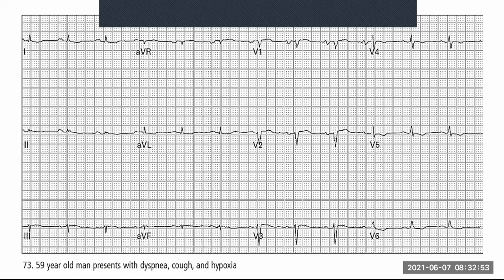But if we were to look at lead 2, where we would normally get a rhythm strip, does that look like a normal P wave? Not at all, is it? In fact, the P waves look a bit weird over there. Agreed. They look almost biphasic. So we know P waves are not normal in morphology. Does anybody know what this type of P wave is called? Okay, we'll get to it just now, don't worry. Let's say the one in V1, or even in V2, or even in lead 2.